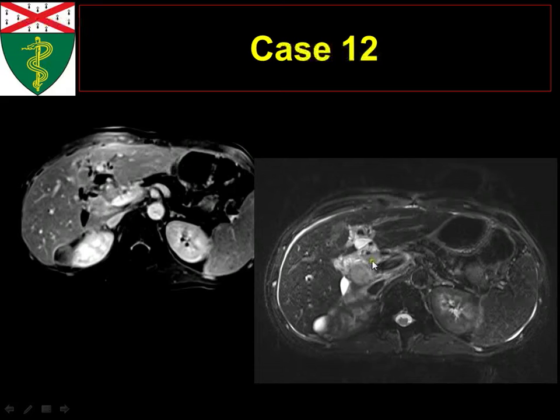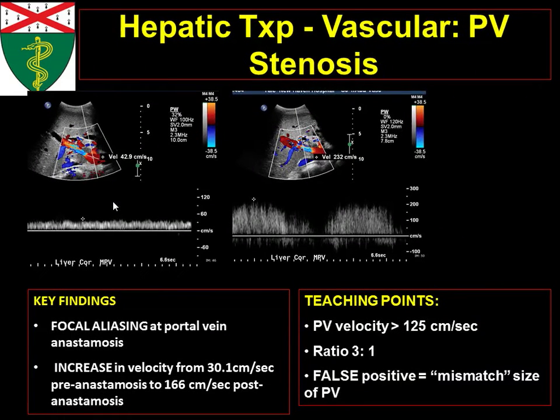It's like soft tissue density. Yeah, I don't know what it is either. I mean, it looks like there's some adenopathy or soft tissue. This is a T2 weighted image. It has this bad T2 signal here. It's enhancing. For my money's worth I thought there was going to be PTLD or something, but this actually resolved. Maybe it was PTLD and they decreased immunosuppression, but they didn't biopsy this, they didn't do anything about it, and it actually got better. But this just goes to show that this is the reason you had portal vein stenosis, because you had adenopathy pushing upon it over there.